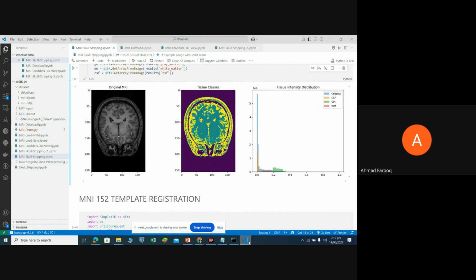Okay, and one final question. Can we have a filter of some sort that gives us the option that, okay, we want to do skull stripping, but we do not want to do intensity normalization, or maybe we want to do intensity normalization? These filters are also available in the form of checkboxes or radio buttons. You apply that, and it runs.